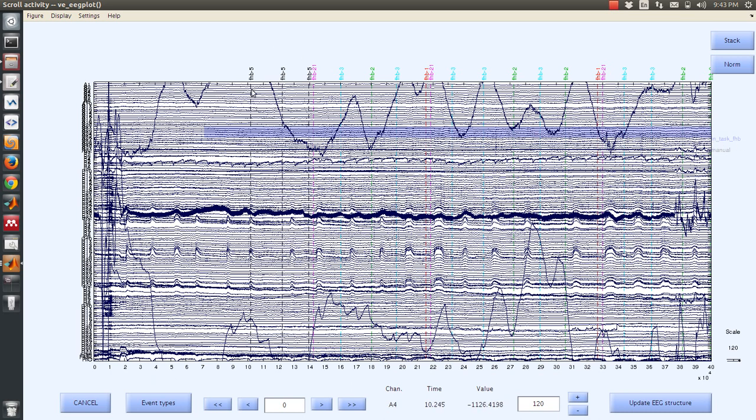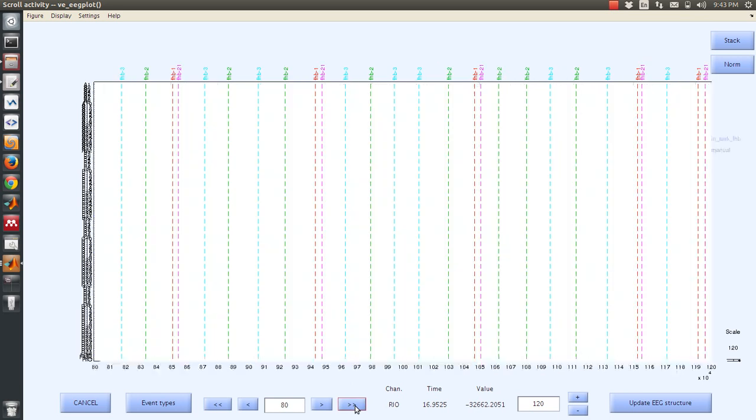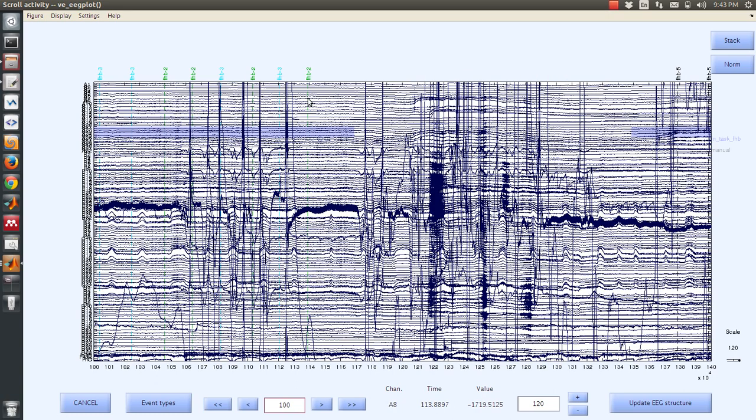And we can see that the duration that this is on starts 3 seconds before the first event of this type. And if we scroll through the data, we can see that it stopped during the break. Stopped 3 seconds after the last one, and then started 3 seconds before the new beginning. So this is how we annotate based on events in the data.